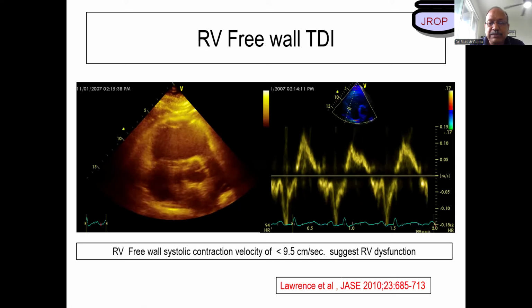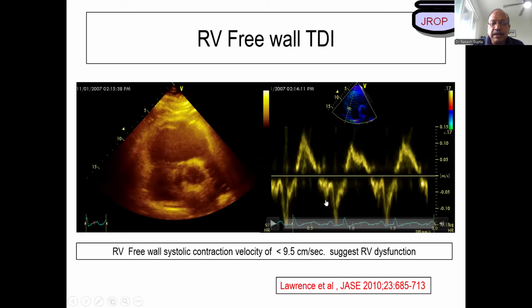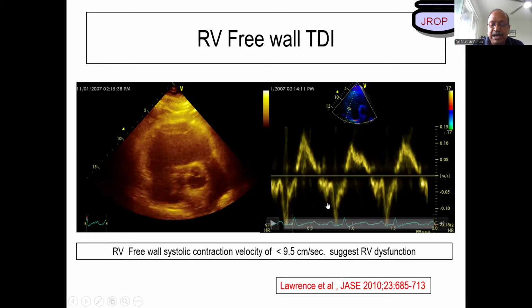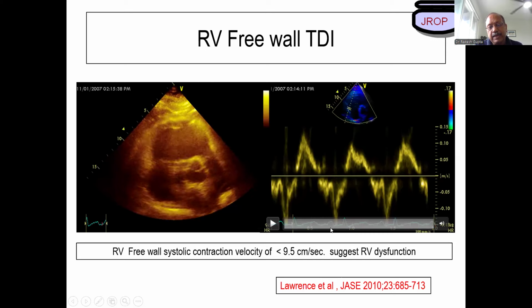I hope you understand what I'm saying. A prime and E prime, why is it going down? This is E prime, this is A prime. Why are they going down? Because if the contraction is happening towards the apex, the relaxation will happen away from the apex. That's why we get E prime and A prime. Okay.